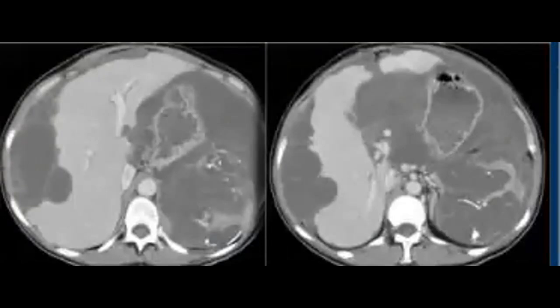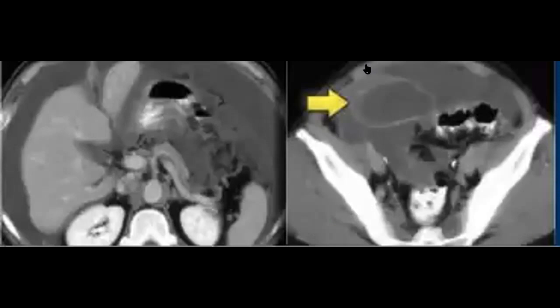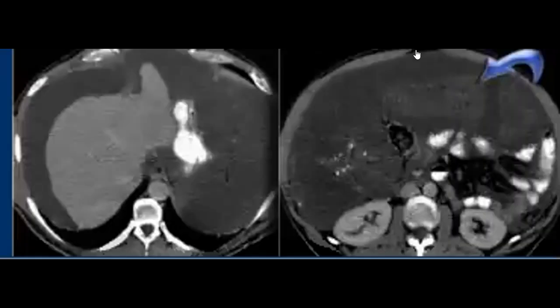They like to mention this in the adenocarcinoma of the appendix or any mucinous forming tumor. So the characteristic scalloping of the surface of the liver. Yeah, the colon and the ovary as well. So it can be from mucocele of the appendix. With thickened mesentery. All these are forms of pseudomyxoma peritonei.